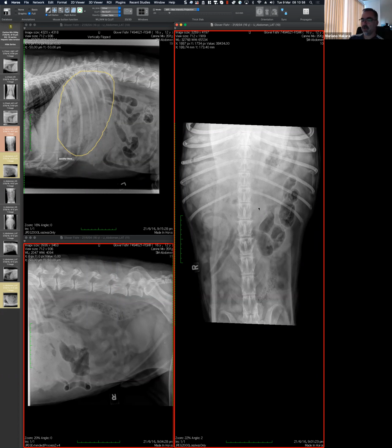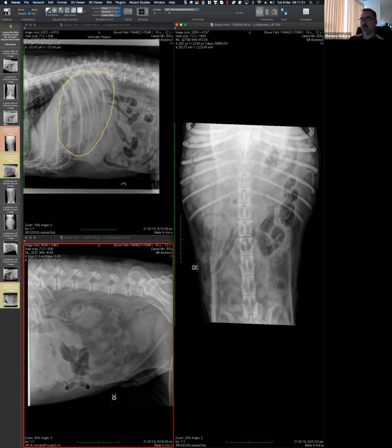Okay. So you're putting all of that together. But I think when I look at the other views, even though the front bit's cut off on the right lateral, maybe the lines I'm looking at are actually just the ribs, and I'm imagining that that's where the stomach would be. So you're saying I see something there, but I'm concerned that I may be making that up using the borders of the ribs. And also my brain may be tricking me because I have the expectation of the stomach being there, and then I can just make an image up.